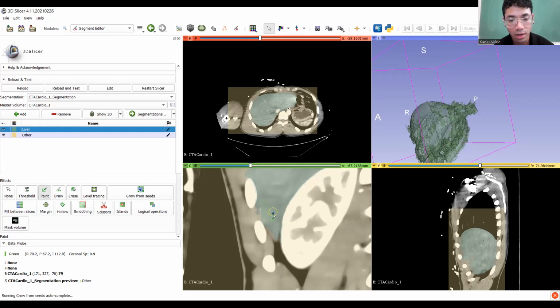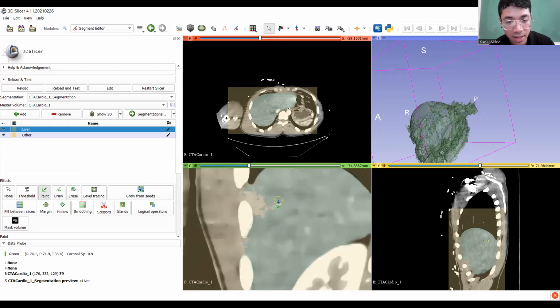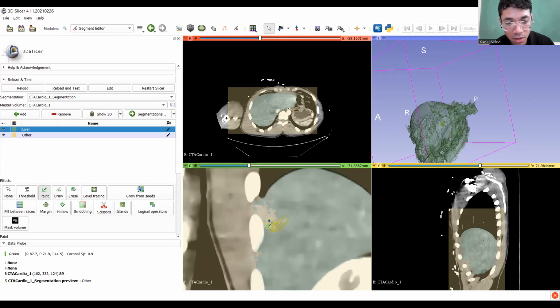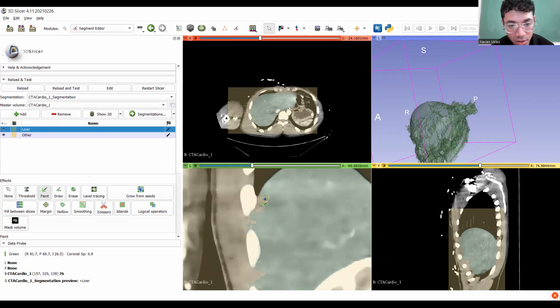And that looks pretty solid too. Again, not perfect, but there are going to be so many other tools that are going to help us perfect it. Up here, same thing. We want all of that stuff. So we're going to select that. Nice. Okay. I'm going to run through this super quick.